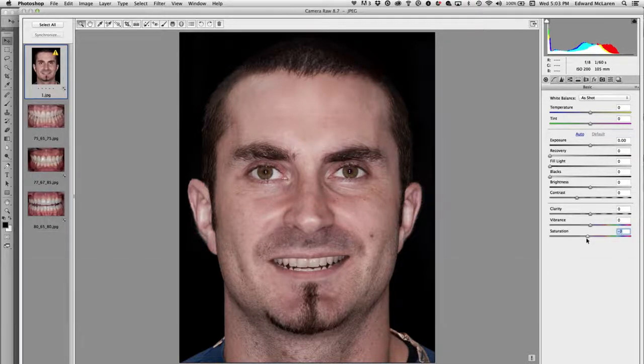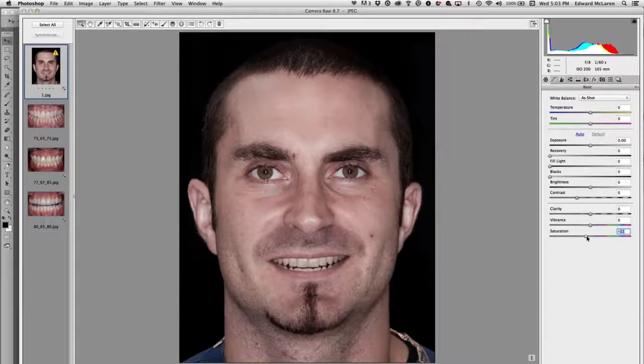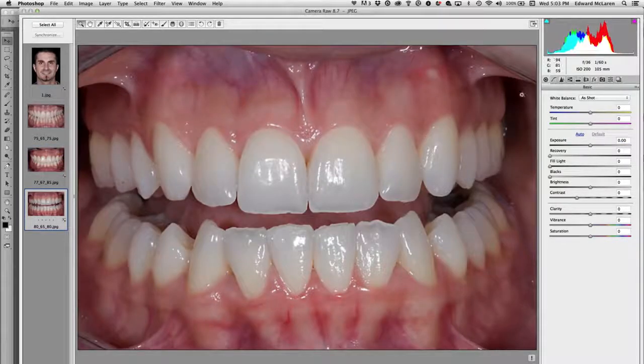I don't like the saturation. I'm going to take down the saturation, not that much, just a little bit here. On this, I think that image is slightly oversaturated. It's maybe a little bit too much down, maybe a teeny bit brighter. Okay, let's take a look at this. That looks okay. A little bit dark on this image, so let's take that up just a little bit. Possibly just a teeny bit too saturated. So again, just making some quick visual adjustments to how I like it.